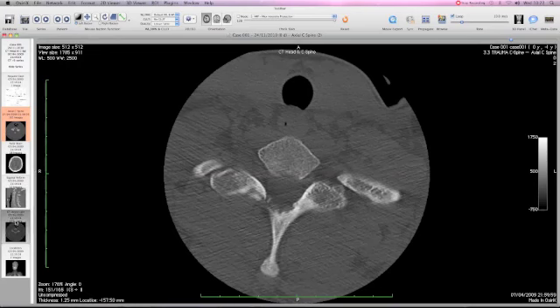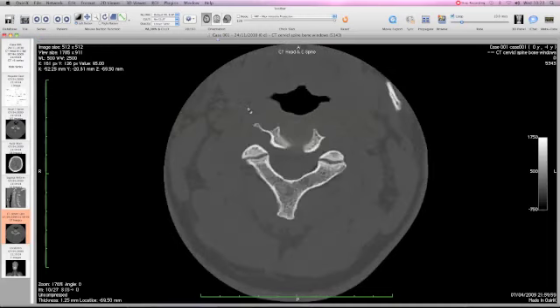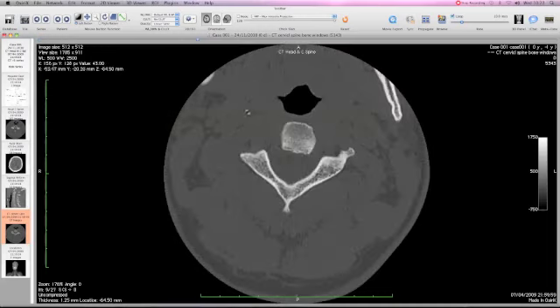What we can now see is that a second data set has appeared with axial images on the left-hand side of the screen with 27 images in, whereas the original data set had 165 images. This is a much more manageable data set when you're teaching.